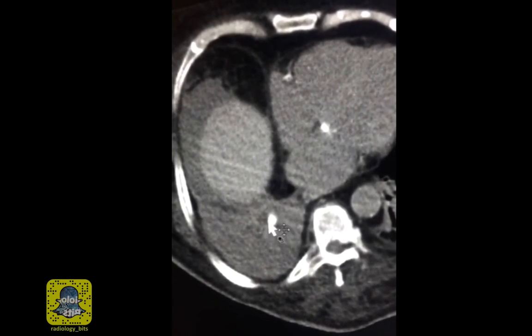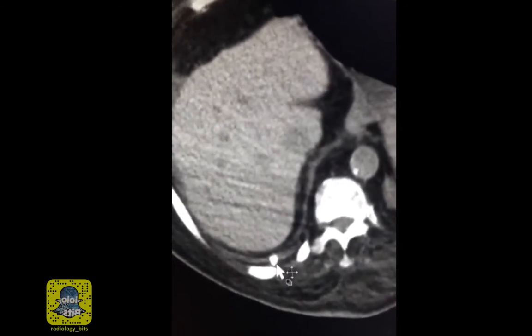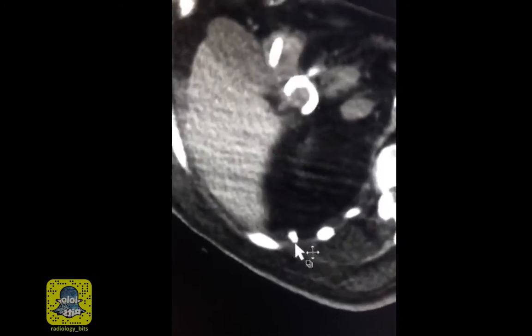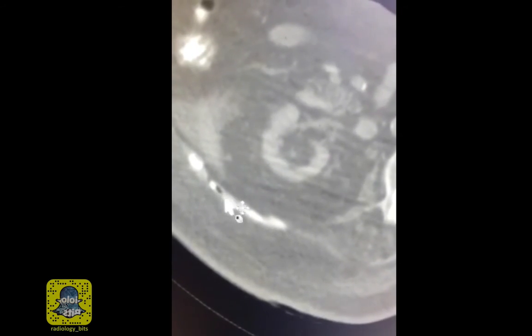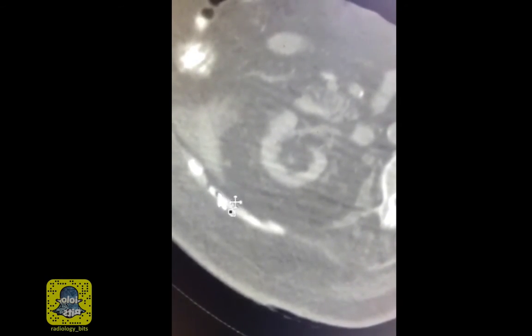So this is a tubular structure that runs within the opacified right lower lobe, crosses the subpleural space that we talked about yesterday, runs lower down within the subpleural space, and dissects into the upper abdominal wall in this region. On bone window, you'll notice that this high density structure contains these dark areas which represent air containing side holes. And now you could see that this is actually a tube with a radiopaque marker.